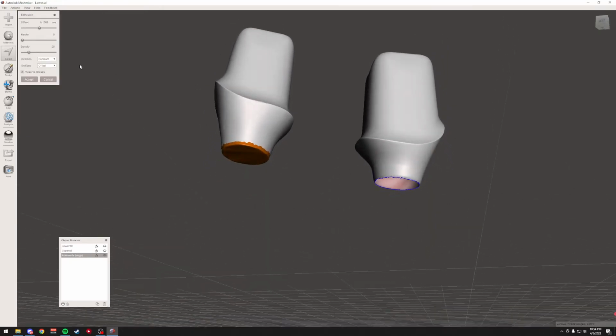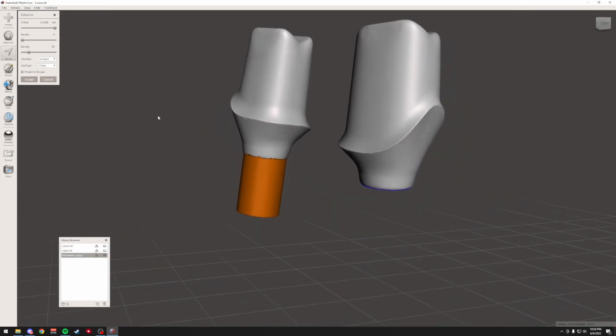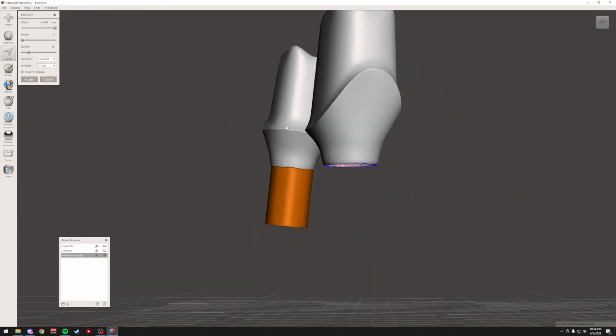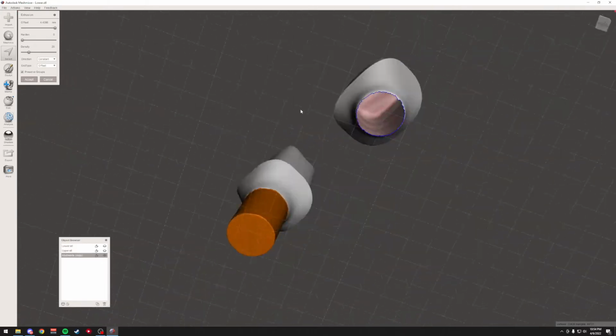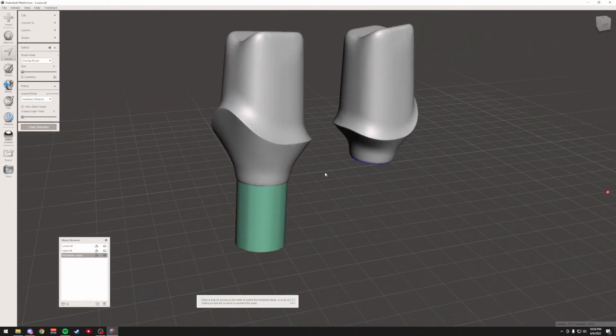And so now I can take this and bring it way on down here to where I could hold that in my hand and seat the crown on there. It'd be a whole lot easier for me to stain that or do whatever I need to do and not worry about getting something on the abutments or having to deal with hemostats or something like that. So that's just an extra thing you can do.